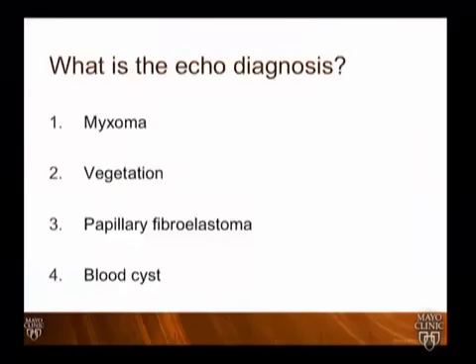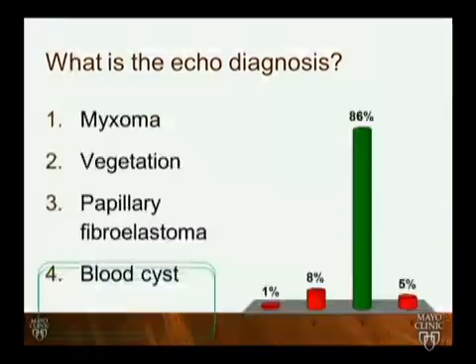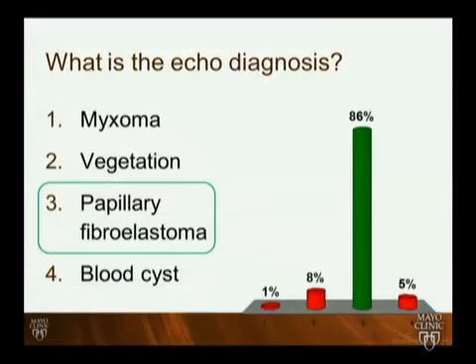So here are your options. Is that a myxoma? Is it a vegetation? Is it a papillary fibroelastoma? Or a blood cyst? Excellent. Okay, 86% got that. That's a papillary fibroelastoma.